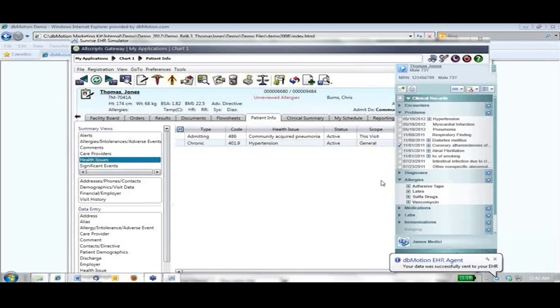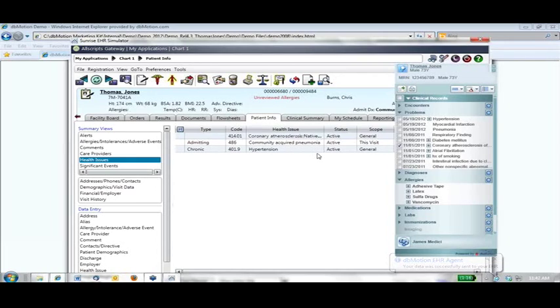And if I want to move that to my problem list, I'm going to hit send to my EMR here. See, it did that down on my system trail, hit refresh. And now the workflow is not going out, pushing, pulling, all these terms that we've used in the past. It's really almost as if I'm dragging and dropping something from someone else's problem list onto my current problem list.